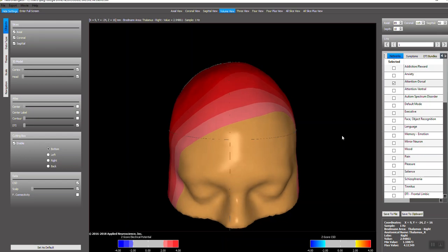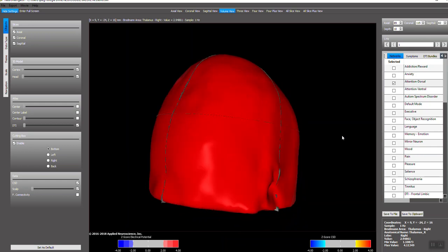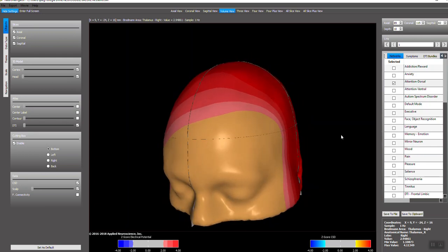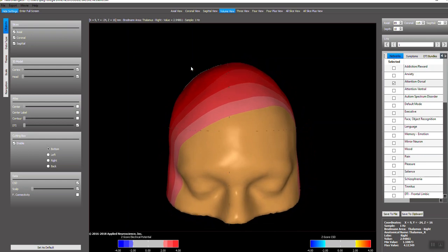This is a review of a new release of NeuroGuide. The Navigator will be in the next release of NeuroGuide, in which we've improved the quality of the shading for the head model here. You can see this is the scalp EEG, actually. We can view in real time.